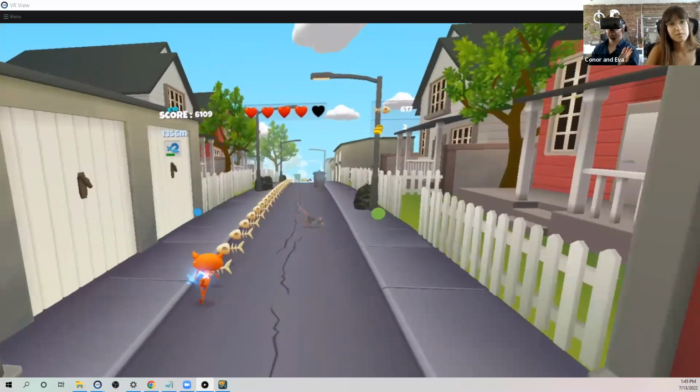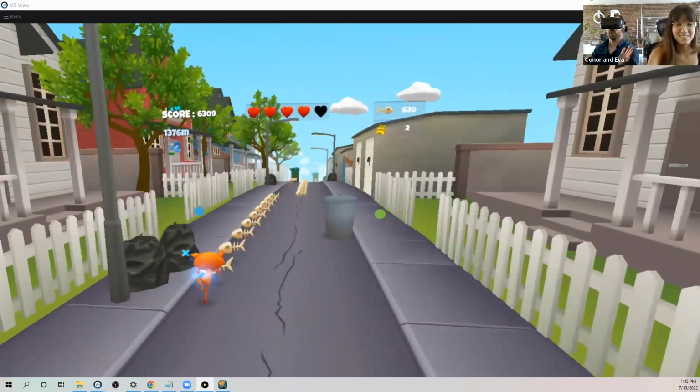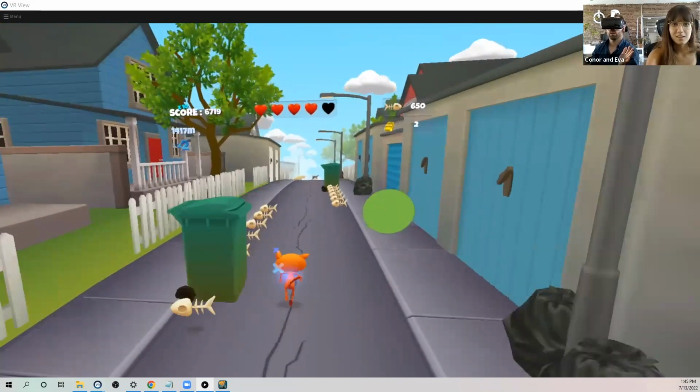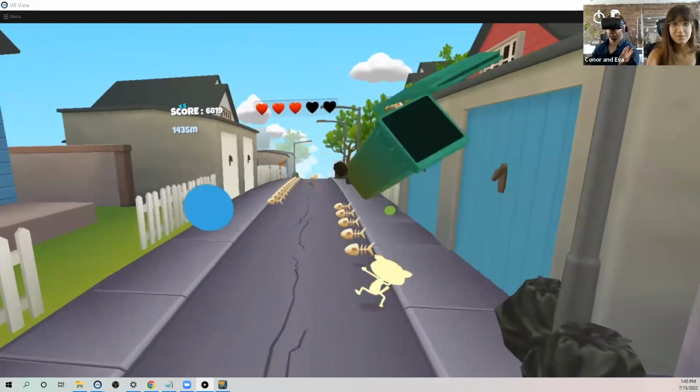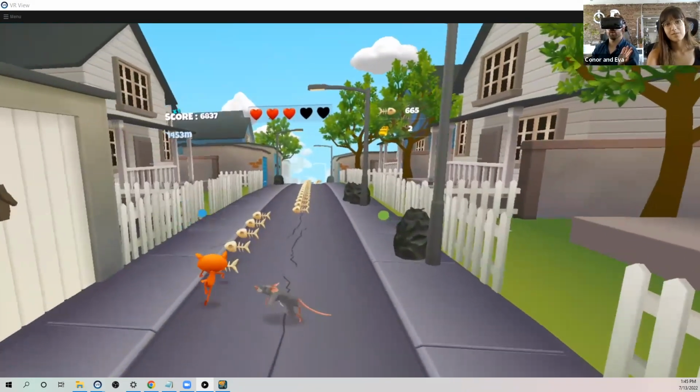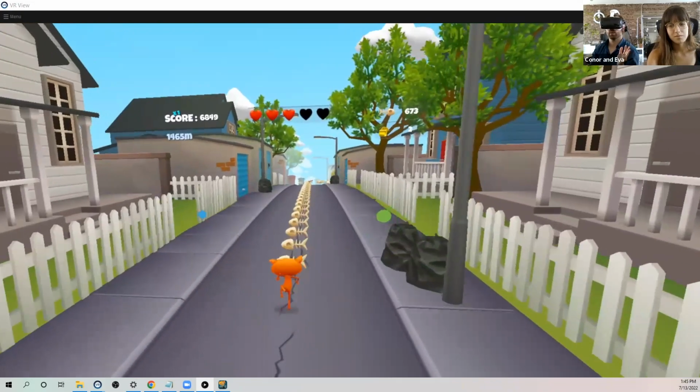All right, cool. We don't have to do this all day, but you can see that once you get the hang of it. Nice. I tried to get a little bit too tricky there, but it's very reliable once you train on it.